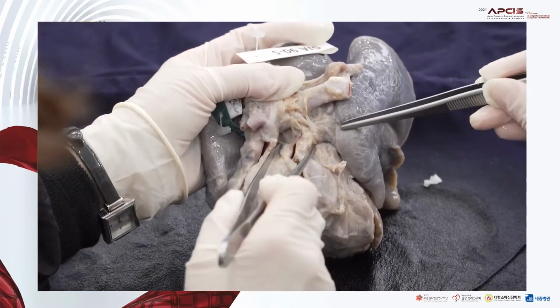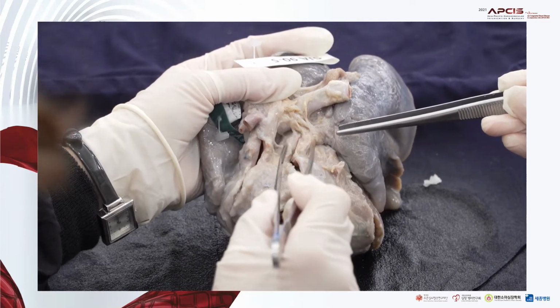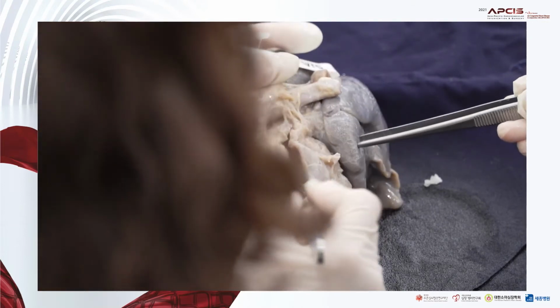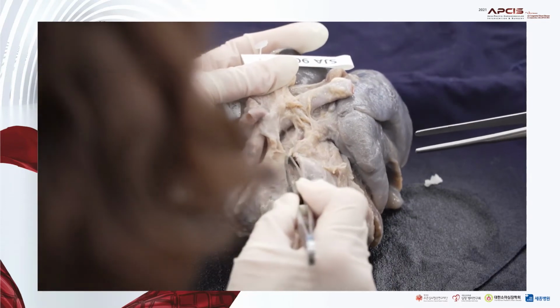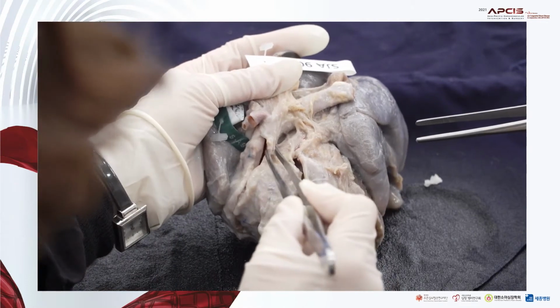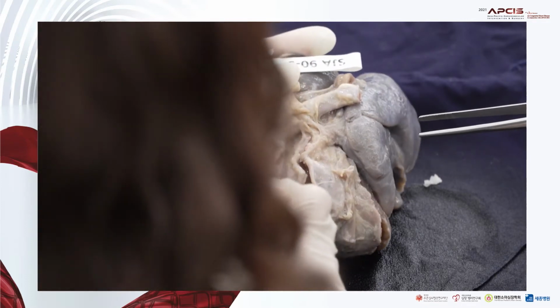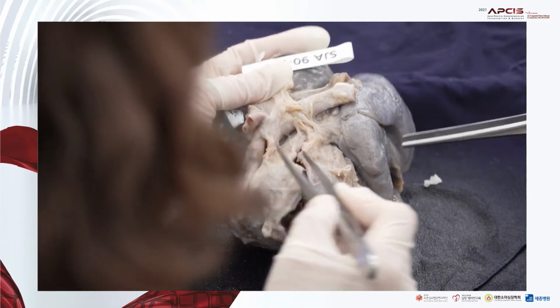And this is the pulmonary trunk. The size of the two vessels is similar. And this ascending aorta is positioned right-sided; it's not easy to judge whether posterior or anterior. So rather a right-sided ascending aorta.